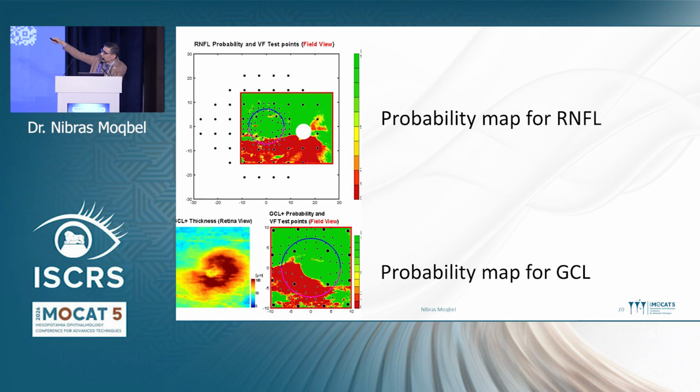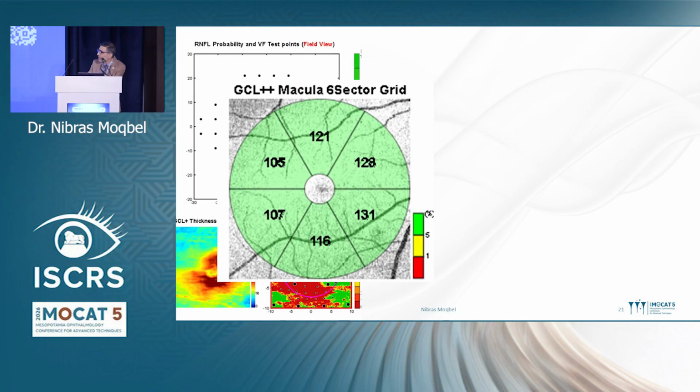And if you notice the last plot on the left side, it's the en face image of the nerve fiber layer. You can clearly see a triangular focal loss of the retinal nerve fiber layer that I would put this red mark on. So this is the second step.